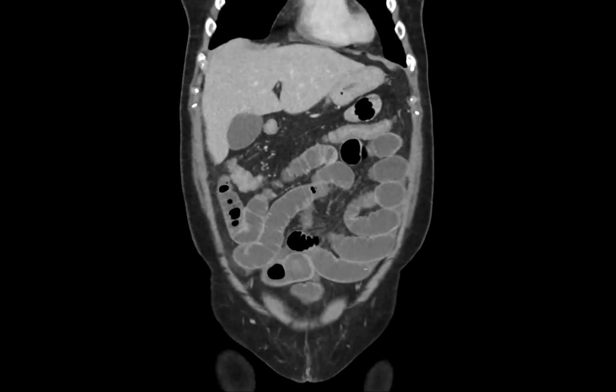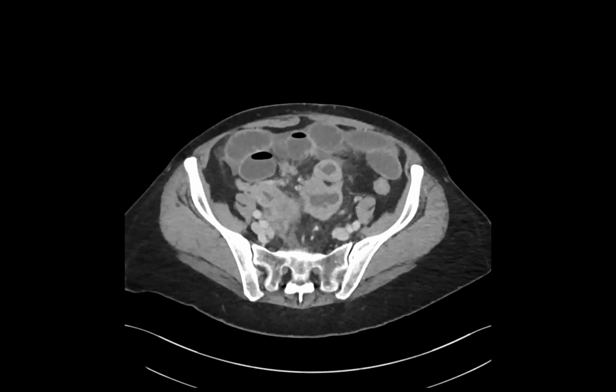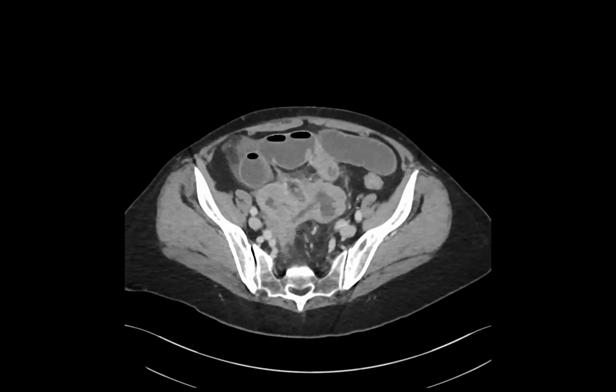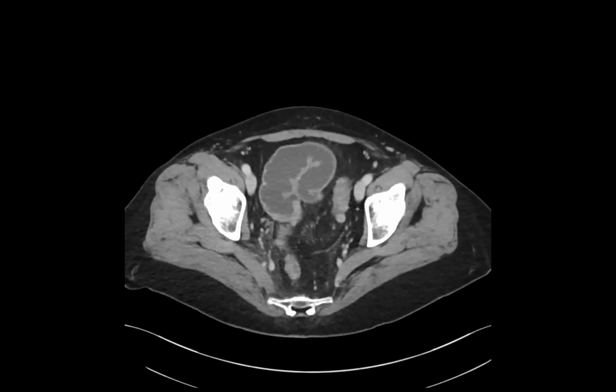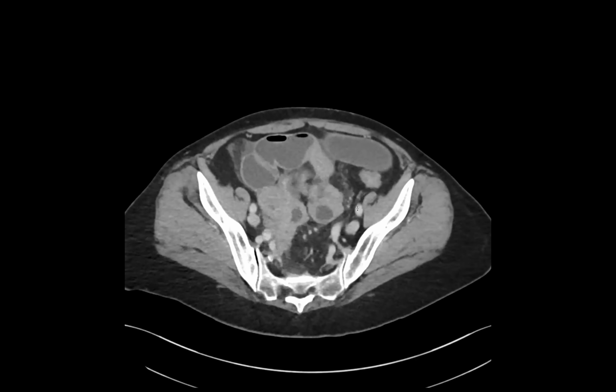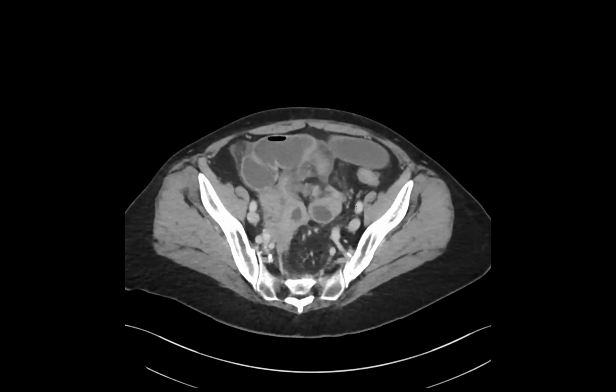Whenever I see fistula, I always think about Crohn's disease. Okay, so you thought. That's what I thought. This is crazy, to come after diverticulitis, and it's small bowel. Sorry, they're not related. Okay, maybe some kind of weird infection like actinomycosis. Lymphoma?